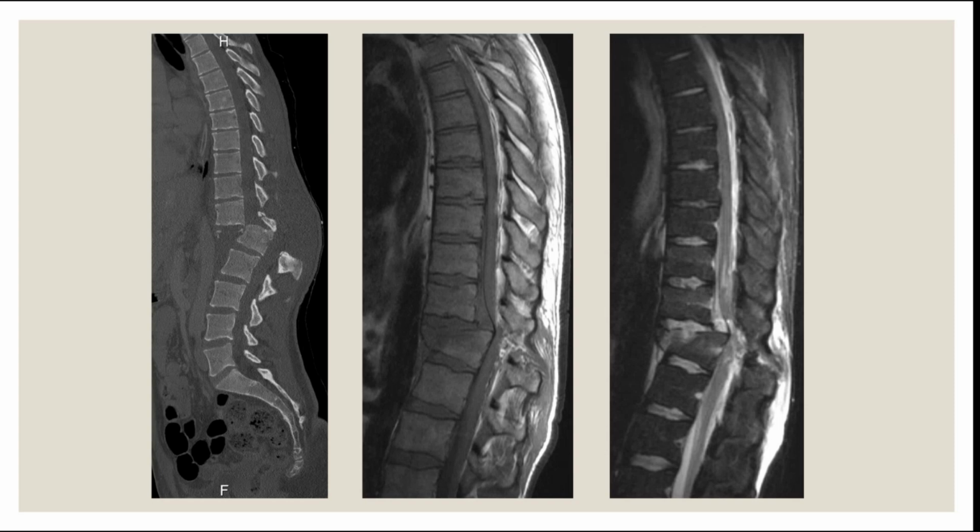Yeah, okay, exactly. The first is CT. That's very right. The first one is a CT because you can see clearly the bones. You can't really see the soft tissue, but you can see the bones. And the other two are MRIs, but different modalities. So which modality is the first MRI, and the second one? Exactly. The first one is T1 and the second one is T2.